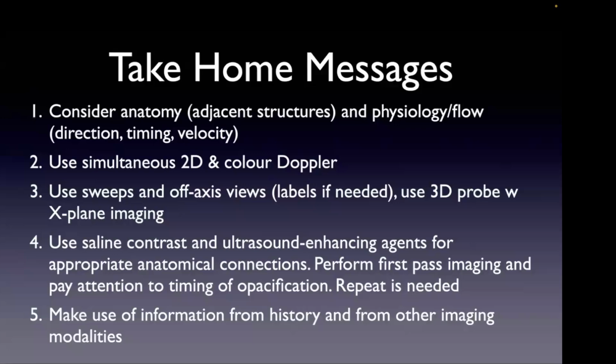And then use of other imaging modalities. For example, I wouldn't be able to tell that was an esophageal stent unless I looked at the history. You can make some inferences, but you can leave that correlation.